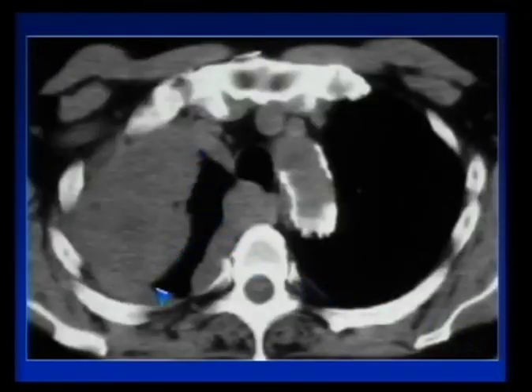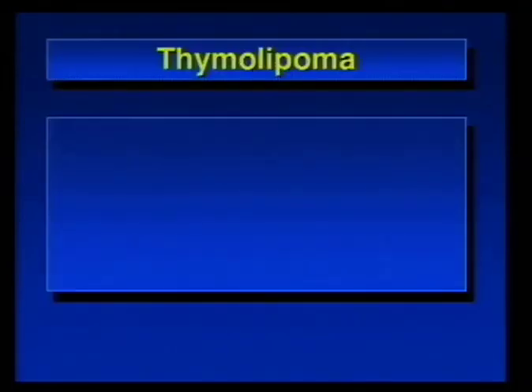How about this? This is a patient with a known thymoma and masses in the pleura. So invasive thymomas can invade the mediastinum, or the lung, or the pleura. And in the pleura, these are called drop metastases. So pleural masses, differential diagnosis includes thymoma, invasive thymoma with drop metastases. And I will be discussing pleural masses later on in this talk.